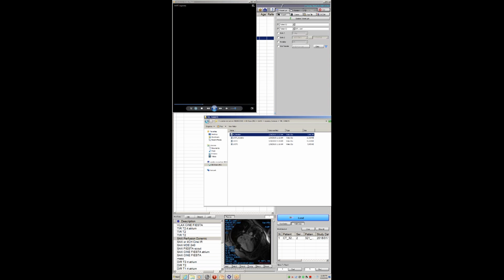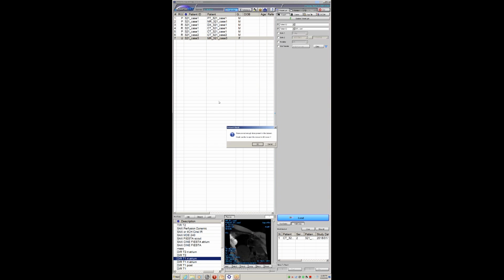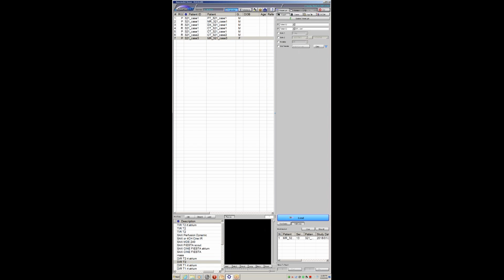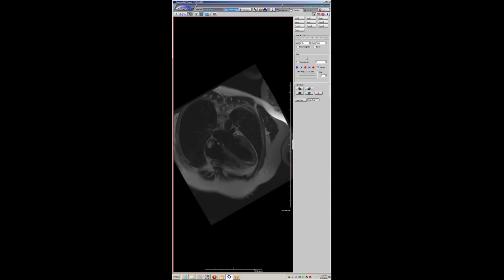None of this is going to work well. And then I will show you the patient had those masses resected, and let's see if I can show some of them here. And she presented with multiple other lesions, here we go. Here's another one, very bright on T2 weighted imaging, and these were taken out. The first lesion I showed in echo was taken out a few years ago. She had 2 taken out. They were both myxomas. And then here is another lesion that grew, another myxoma.